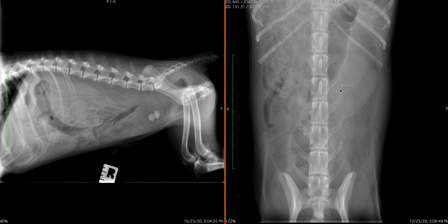We also observe that there are several small mineral foci in the region of the renal pelvis and diverticula. In the peritoneal space, we observe that a mild amount of serosal contrast is reduced near the apex of the urinary bladder. Two mineral opaque foci, or calculi, are superimposed with the urinary bladder on both views. They are noted on orthogonal views, and therefore we can make the assumption that they are within the urinary bladder.